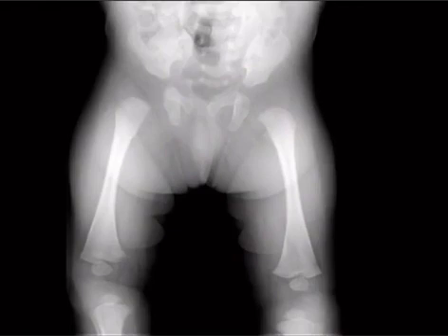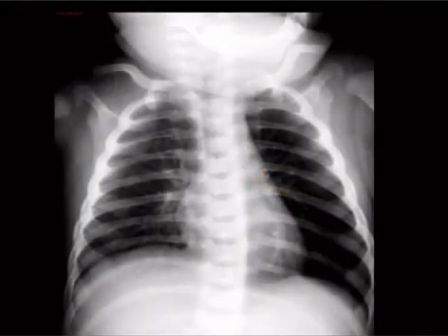All right, next case here. Let's take a closer look. Right there, boom, metaphyseal corner fracture. So that's an immediate buzzword for child abuse. Start looking around. You get your skeletal survey. Notice there are rib fractures, especially if these things are multiple ages, right?